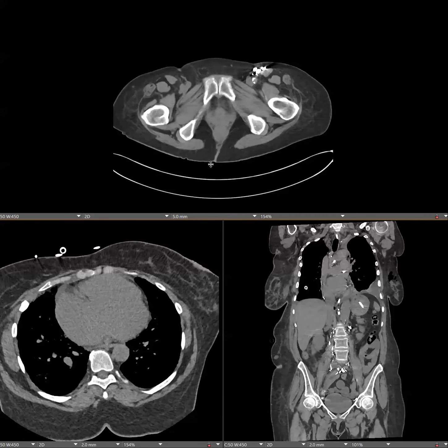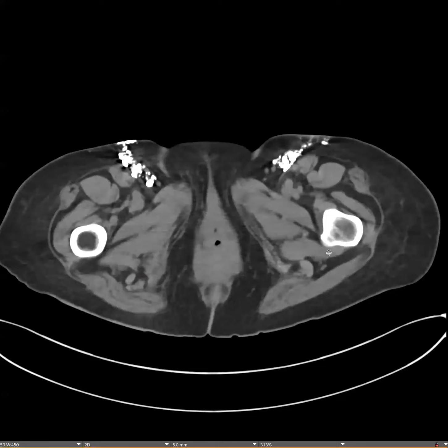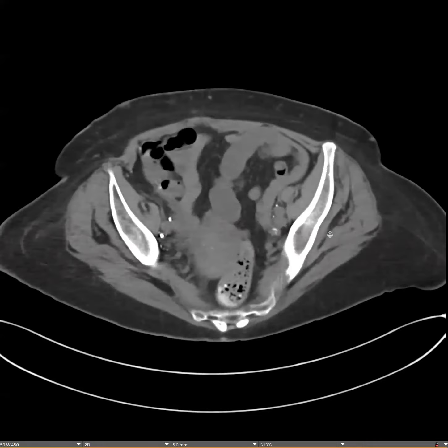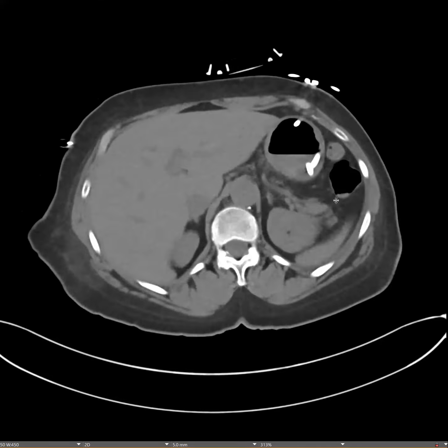So this is a young patient whose history I'm not going to tell for now. You can check for yourself, and then I'll tell you the history. The history makes it very obvious. So this is what we find. It's a non-contrast exam of the chest, abdomen, and pelvis.